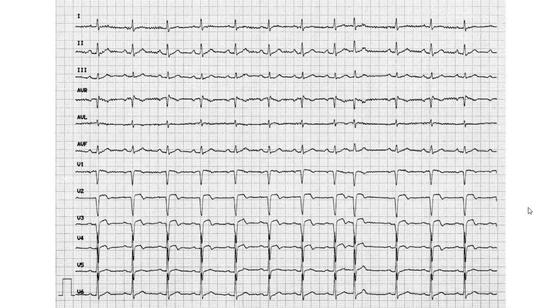Now, question 13. I'll give you a few seconds to work on it. So, what is 13? Alright, so we start off. Is it regular or irregular? Let's start off.